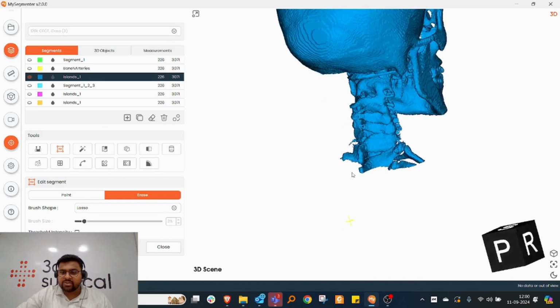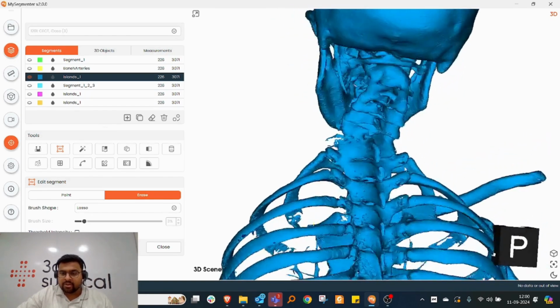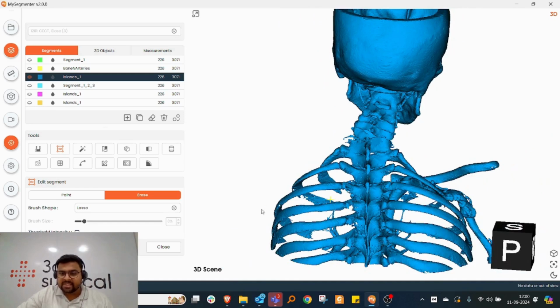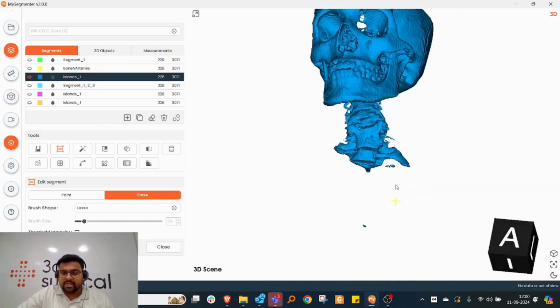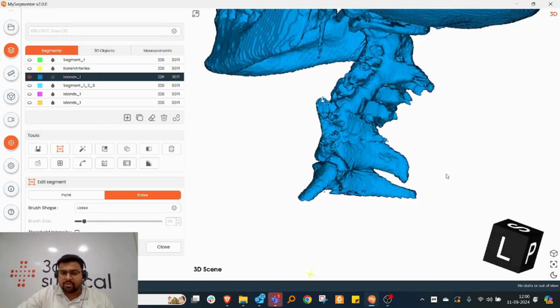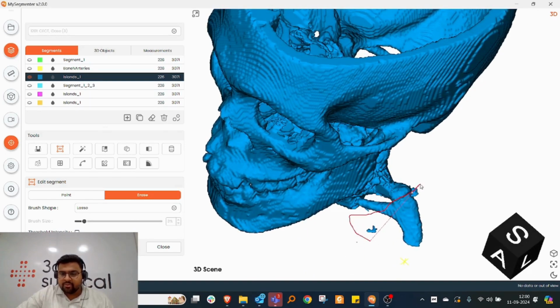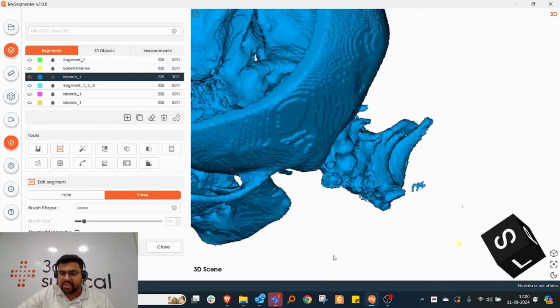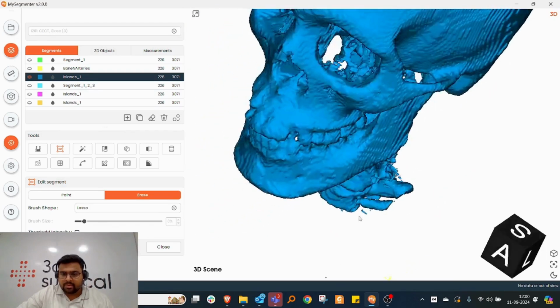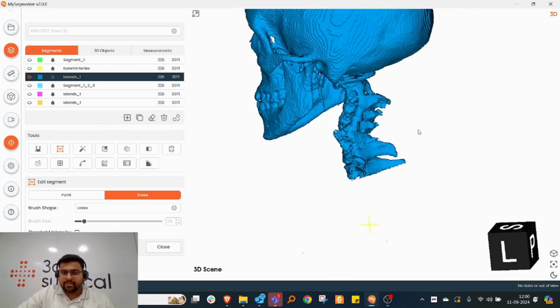So that is much easier in such complex cases. So let's see, I am allowed to do the direct cut operation on the main 3D mask itself. So let's say I'll remove the information from here. Okay, so that will leave me with the cervical spine, and for reference I will add one more vertebra of the thoracic spine as well. Okay, so now again I can remove this. I can quickly edit on 3D itself. Okay, and let's see, for now I'm good with this.